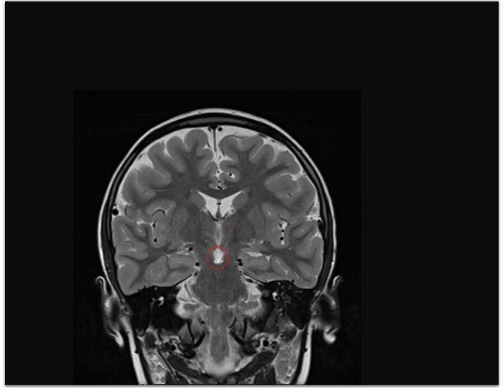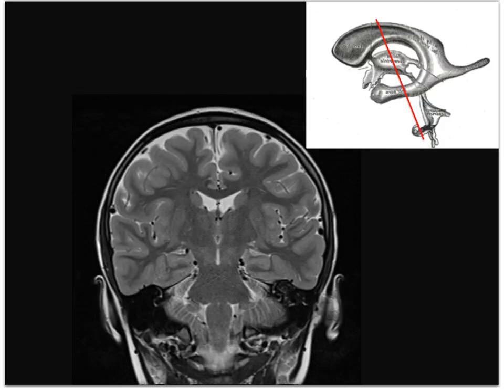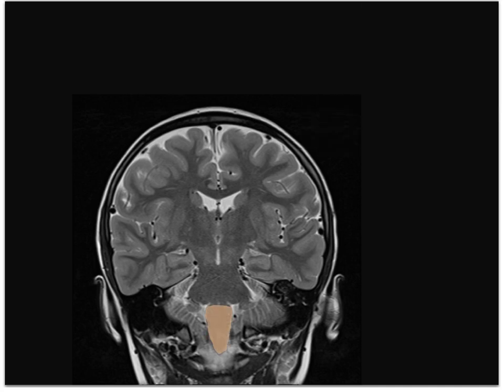Tiny bumps in the walls of the interpeduncular cistern represent the third, or oculomotor nerves, exiting. The flocculonodular lobe of the cerebellum is the smallest lobe, and it now is pointed out in the cerebellopontine angle cisterns. At this level, the medulla and pons lie below the tentorium, which is a reflection of the dural tissue that lines the skull and separates intracranial space into compartments.